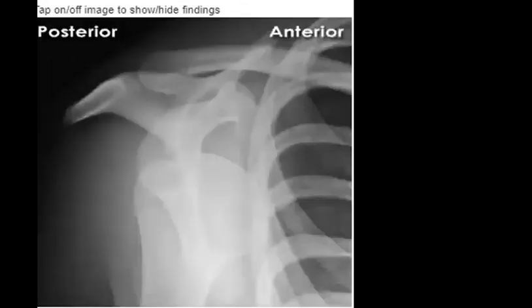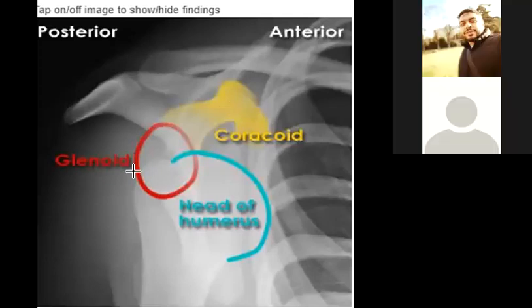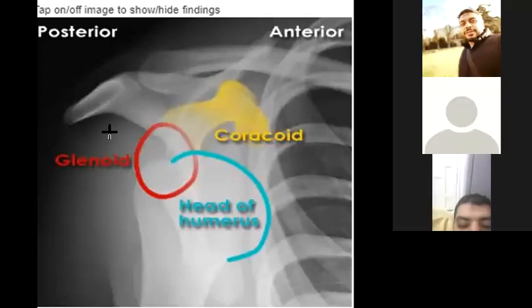And let's have a look at this one. You remember when we talked about the normal, right? Just a few seconds before. So what happened here in this anterior shoulder dislocation? What is the abnormality? The humeral head position should be at the level of the coracoid. So what happened here? The humeral head should be here, but now it goes inferiorly to the coracoid process, right?